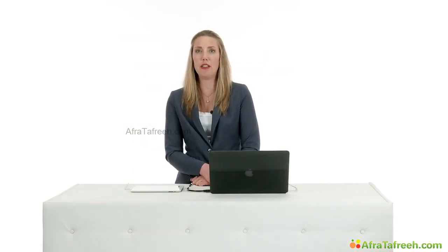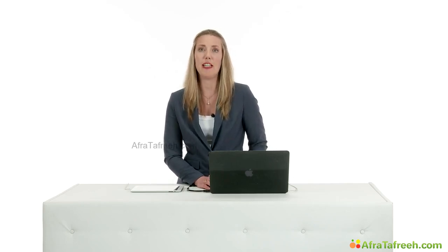We just showed you in this lecture a few different stages of pregnancy, how you recognize them and what they look like in a healthy pregnancy. But also some cases where you have to pay full attention to little subtleties, which will make a huge difference in good quality healthcare. In my opinion, it's very valuable that we make a proper first trimester scan. This can make a real difference in good primary care. You win time if extra care is needed, but most important, you will give confidence, faith, and minimize stress early in a very exciting phase of a woman's life.